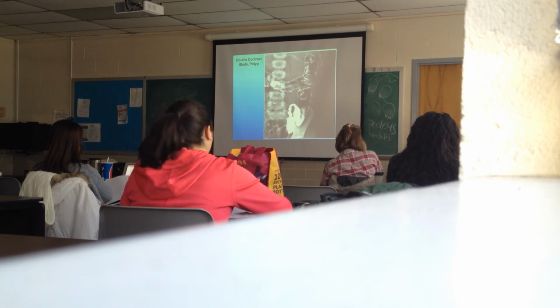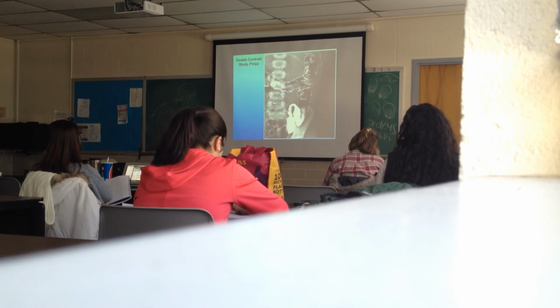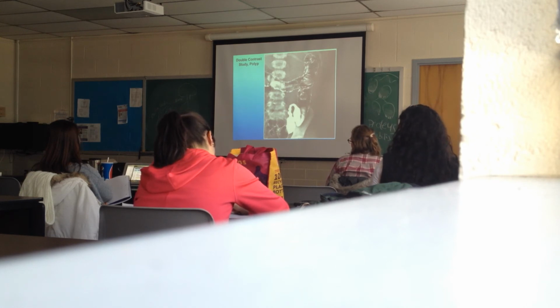Can you recognize a single contrast study when you see it? Wait, why is this a double contrast? Double contrast. Two contrast agents used. Because you see the very light and then just a little bit light? Well, there are two contrast agents used. Barium and air.